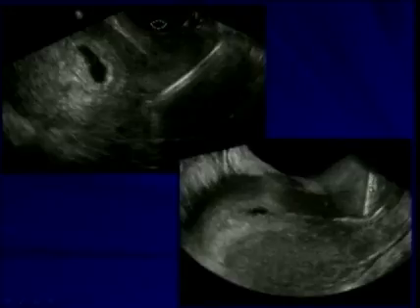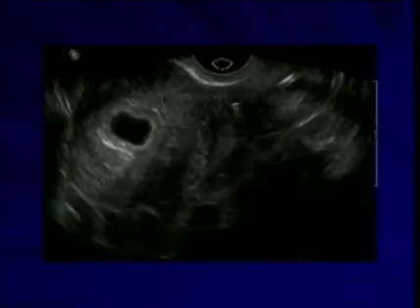Here is a 3D image showing that the long stem of the IUD is embedded into the cervix. Here is the short stem of the IUD in the cervical canal, and the other short stem is located in the upper cervical canal. Here is another example of an IUD. The long stem is in the cervical canal and the short stem is perpendicular to it, coming out at us, embedded in the lower uterine segment in the presence of an intrauterine pregnancy which progressed normally.